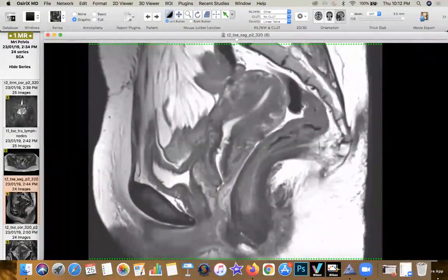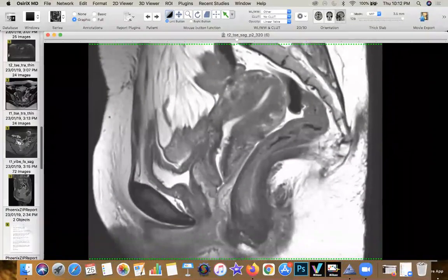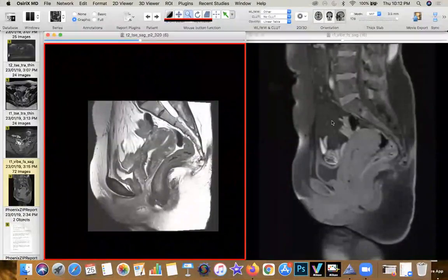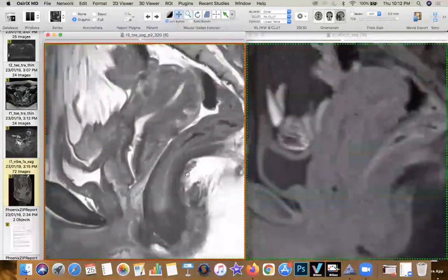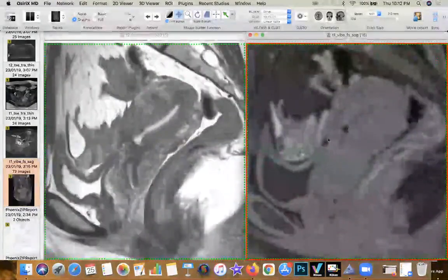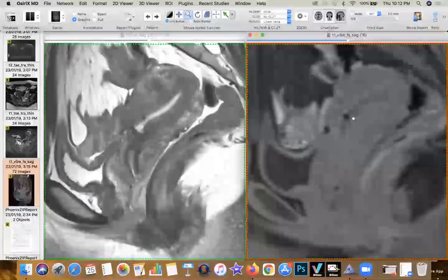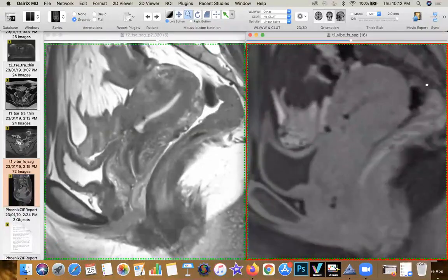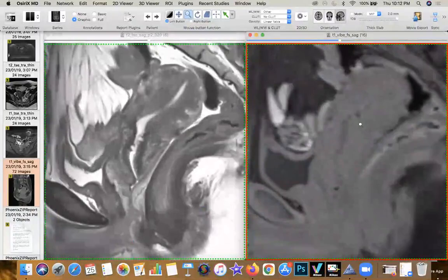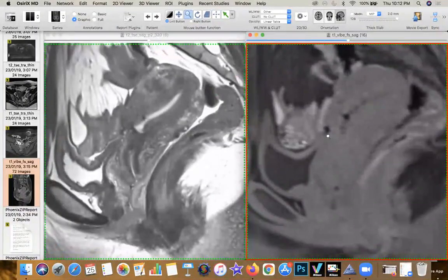So when you have a lower uterine scar, in every patient who's got a lower uterine scar, it's pertinent that you actually see that there is no tissue which is hemorrhagic within the scar itself, because that could be a sign of scar endometriosis that is within or in relation to the C-section area. So here you can see these areas which are T2 star shortening. Now this is susceptibility rather than anything else, which is seen here. You can see susceptibility from air, and you can see susceptibility from surgical clips as well. So when I'm running the sequence, I'm pretty much confident that there's nothing which is T1 hyperintense at the scar.